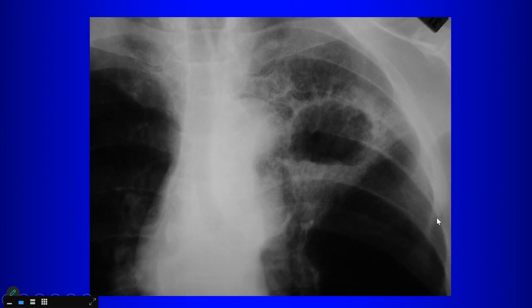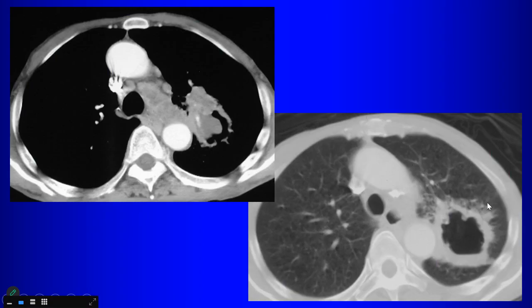So that turns out to be a squamous cell cancer. So squamous cell cancer can present as a cavitary lesion within the lung. And as you said, the thicker the border, the more you're concerned about malignancy. Here's another squamous cell cancer, very thick border, lots of soft tissue along the border. This patient also has pretty extensive mediastinal lymphadenopathy, so cancer really has to be at the top of your list in this case, especially if you think the patient's a smoker.